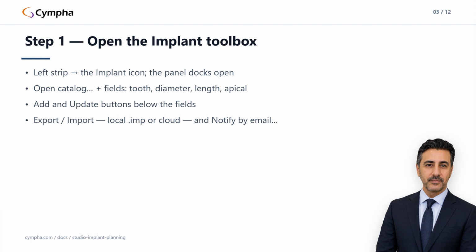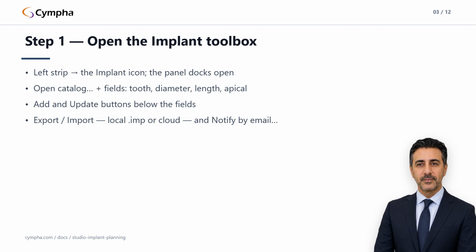One gotcha right at the door. If the panel reads "load a CT volume first," your DICOM didn't finish loading. Go back to Open DICOM and wait for the slices to render before continuing.